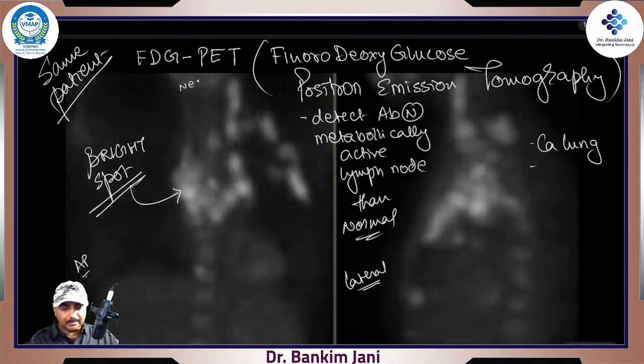This is neck, so lymph nodes, and this is anterior mediastinum. Even the middle mediastinum nodes are there. Some of the nodes are in the posterior mediastinum, very few, but there are. Mostly they are in anterior and middle. So we have lymph nodes in anterior, middle, posterior, and they are extending even up to the neck.